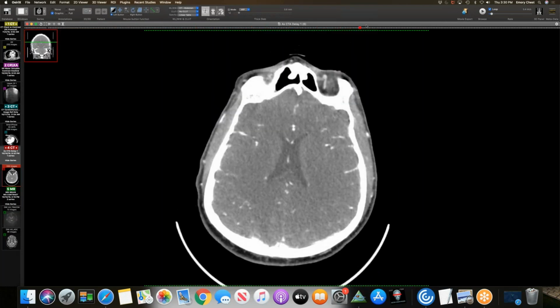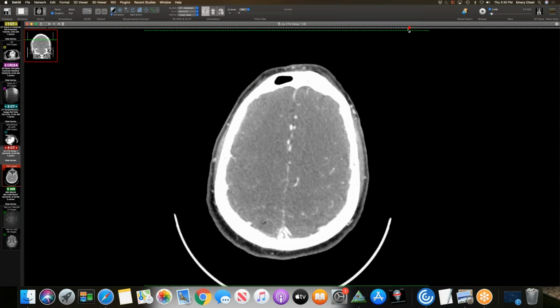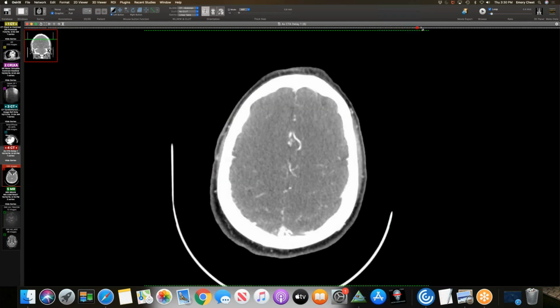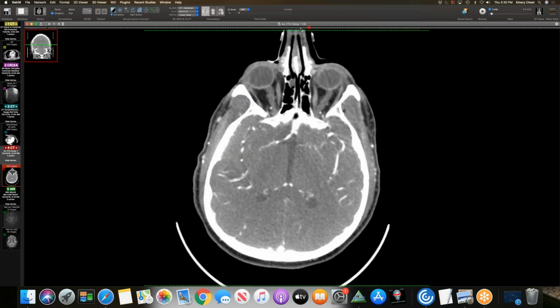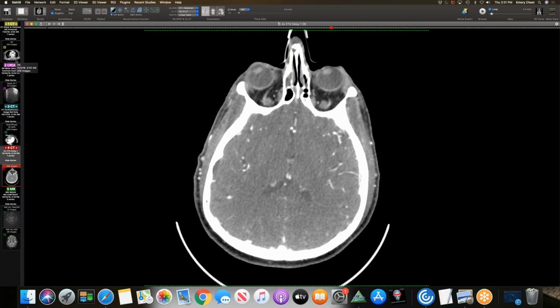And you can see multiple small pockets of gas also in the brain. So that would explain the strokes. And so they called it a left atrial esophageal fistula, and the patient went to surgery.